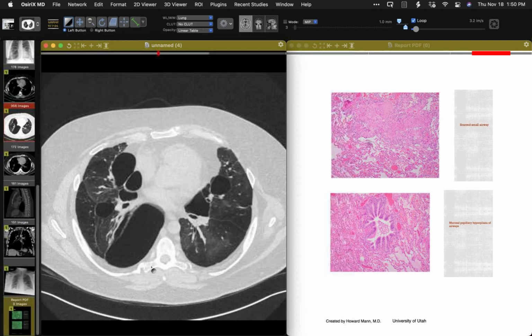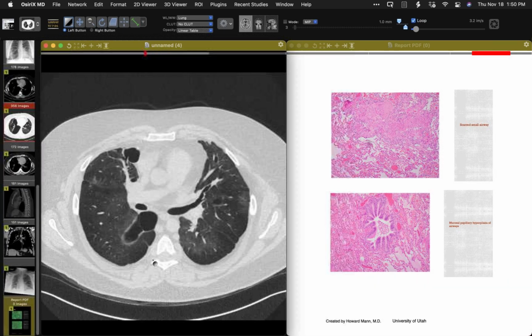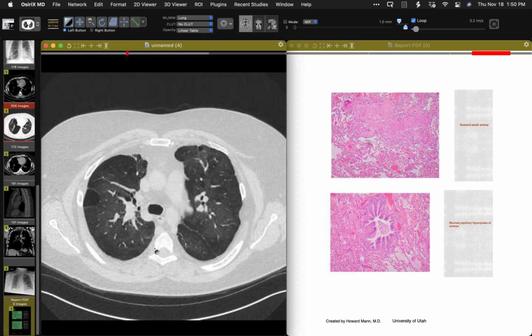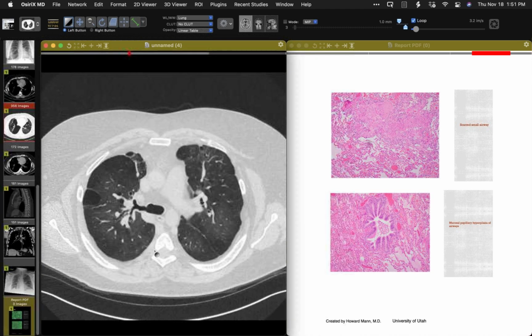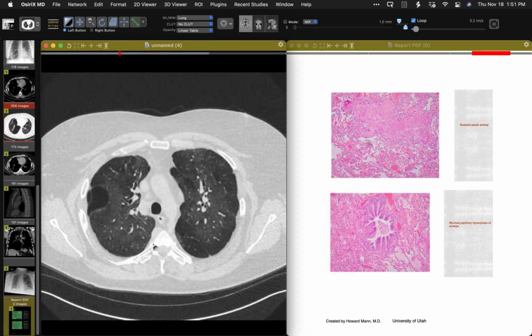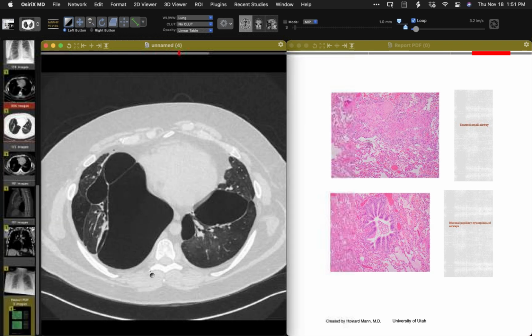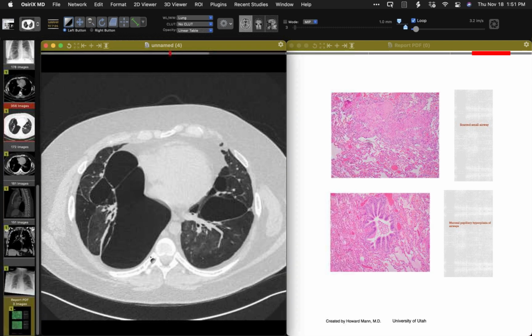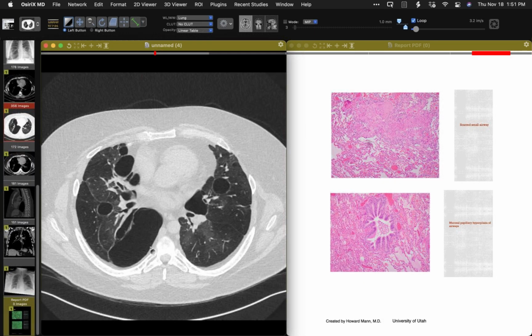Can anyone recall seeing this degree of lung damage from an RSV infection, even if severe? I'm trying to recall. Certainly post-viral constrictive bronchiolitis we're used to thinking about. Well, I wonder if the larger cystic spaces are related to either oxygen therapy or pressure support, sort of like a BPD-like pattern.